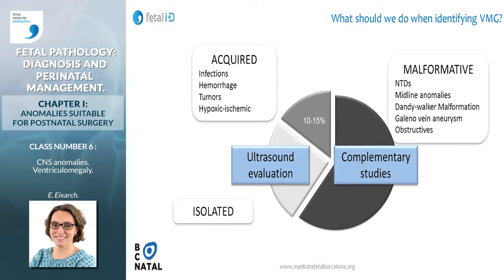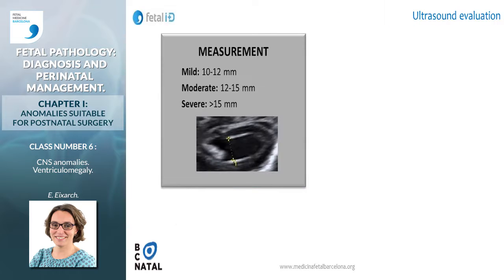And how can we differentiate the different causes of ventriculomegaly? Performing a complementary study and performing a detailed anatomical study. The ultrasound evaluation will help us to identify the cause, and the complementary studies will help us to confirm the pathology. Let's just start with the ultrasound evaluation.